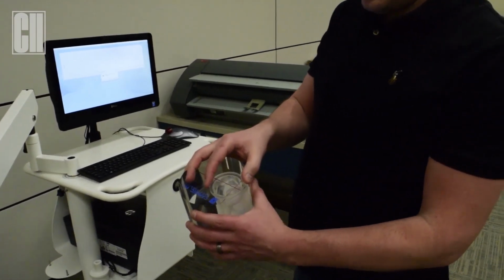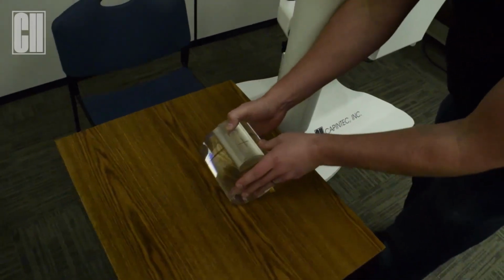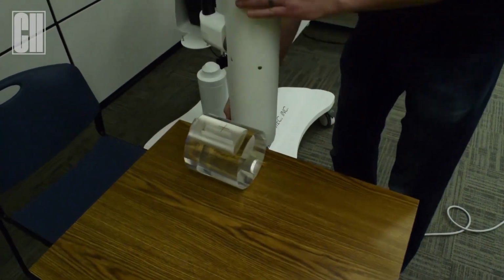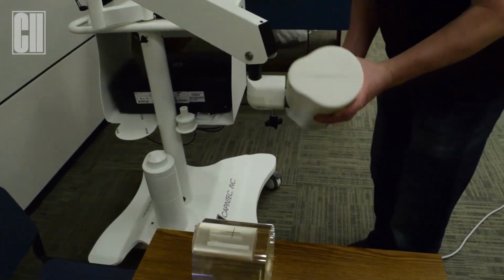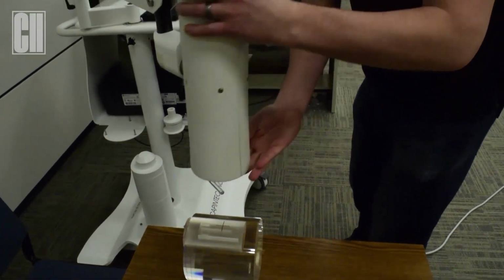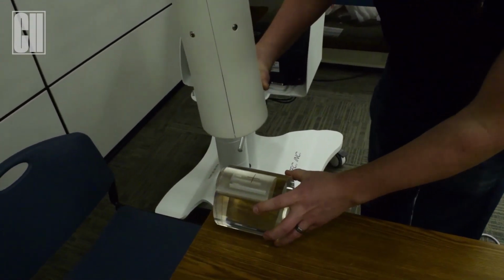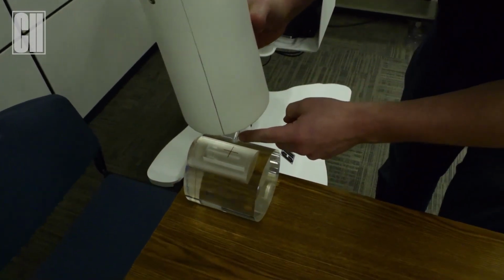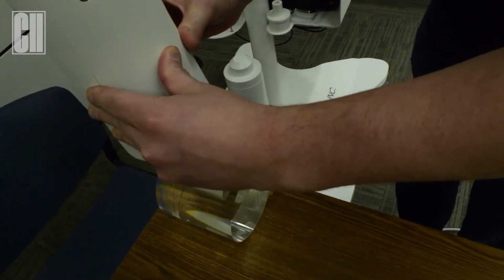So when we have the capsule lined up, in this case, we're going to lay it on the table, down, and aim for our center point. Our goal is to get the line of our pointer rod directly in the center of that cross.